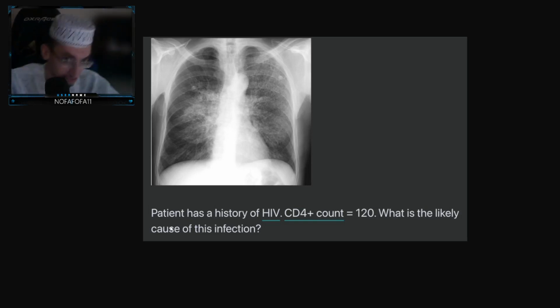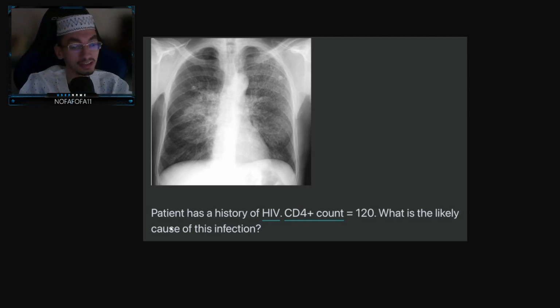Alright, so now that you've paused the video, let's discuss the abnormal finding. The abnormal finding is that this patient has specifically a perihilar interstitial lung disease, a reticular pattern. Now, I'm pretty sure you might be confused as to what I just said, but the description is quite specific. It showcases what the patient's problem is. So, let's look at the patient's case for a minute.